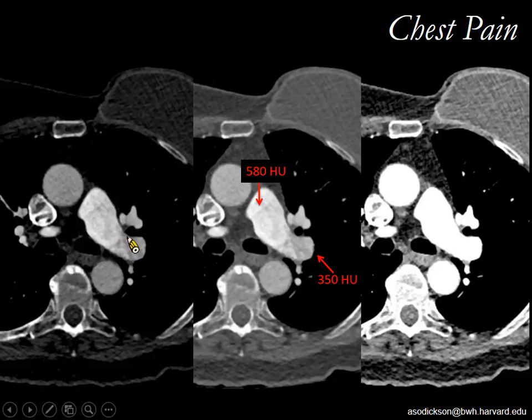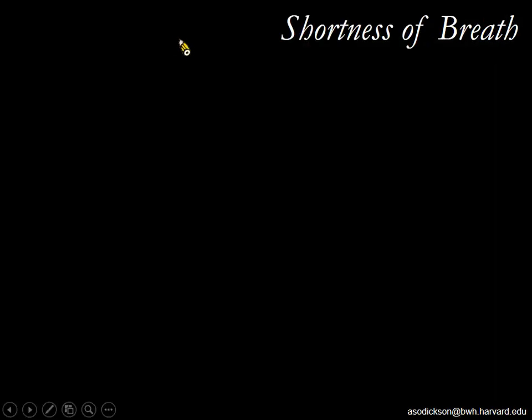See maybe a little curvilinear thing, maybe reminiscent of the air bubble that was moving. This is contrast that's flowing during our acquisition, so it can have a funny configuration at the margins like this. Acute PE, it's a little bit of a funny morphology. Chronic PE would generally be either retractile or would have narrow webs but would not be filling like this. And pulmonary artery sarcoma I just threw in because I needed a fourth answer to my multiple choice.